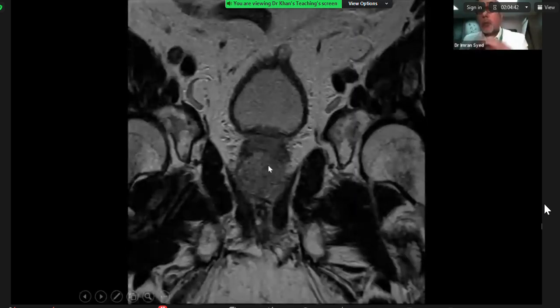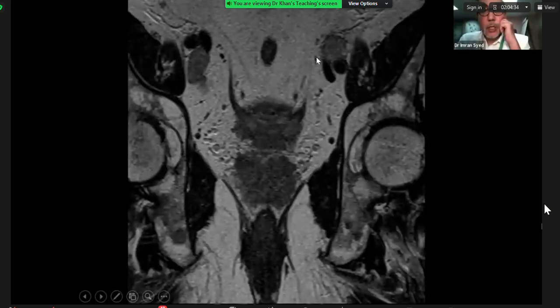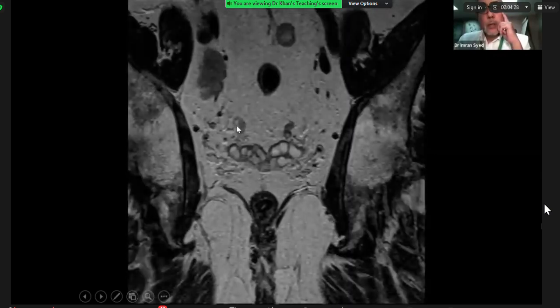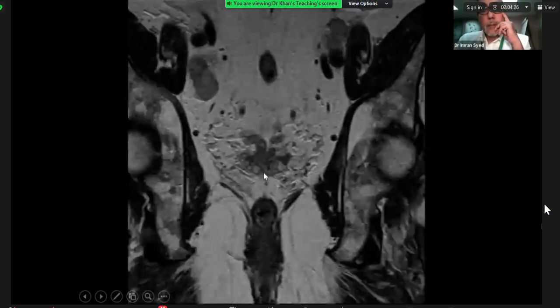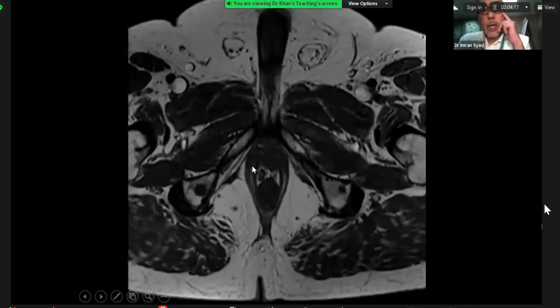Now this is the coronal sequence that I use to further validate any axial imaging showing lymph nodes, and here you can see very nicely large conglomerate nodal changes bilaterally, okay, in the context of this tumour. So contextualizing this, we've got a T3 tumour which has breached the capsular margins, and we've got lymphadenopathy. So we've got T3A N1.